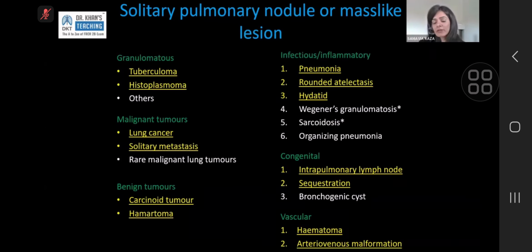Inflammatory lesions can look like lung nodules. But most of the time, if you were used to reporting enough CTs, you would recognize the inflammatory looking pathology looks different. And most of the time, even if they are followed up at the 3-month follow-up mark, they can be dismissed. And you can put down at the end of the report that this requires no further follow-up.